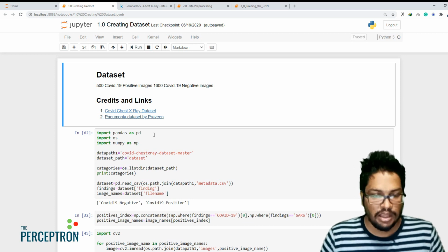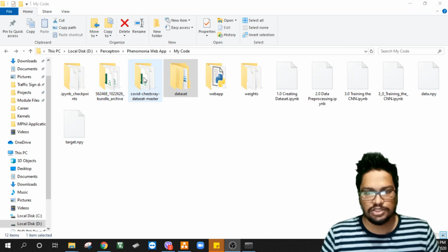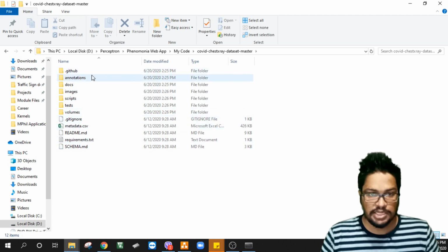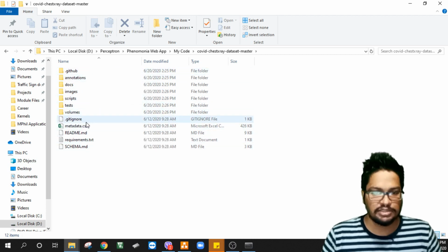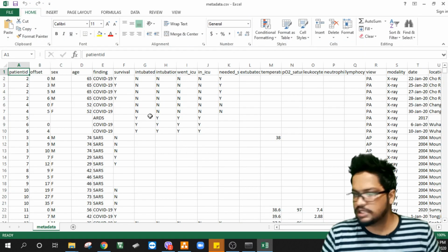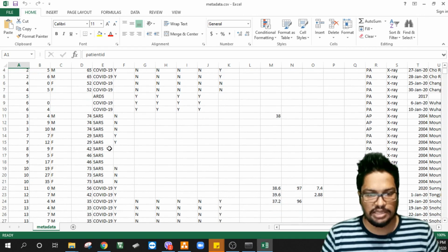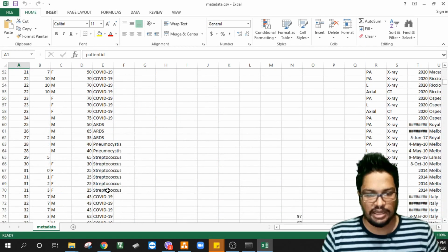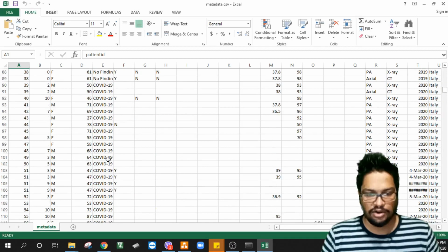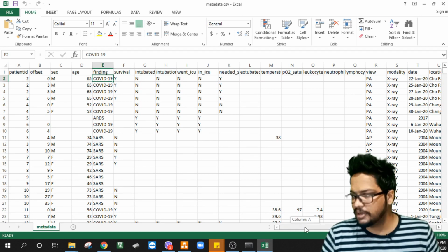in this project. As you can see, we have two datasets downloaded here. This one actually contains the images of COVID-19 and SARS and other stuff. So we can open this CSV file. The CSV file gives us the COVID-19 positive and SARS, and you can see several categories are here, right? Not only COVID-19, but this is the category, and we have to find the image name.